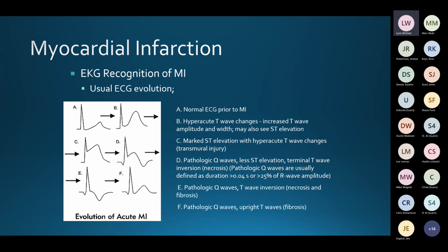Our point is to stop these people at this level here. Be nice if we could stop them at this level here, so there would be minimal permanent damage from that. So this is going to go on. See the T wave is still up.